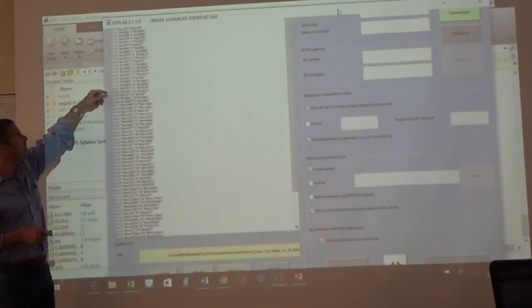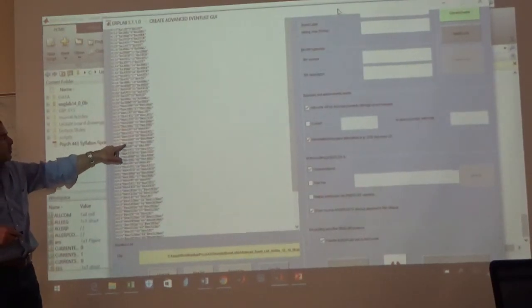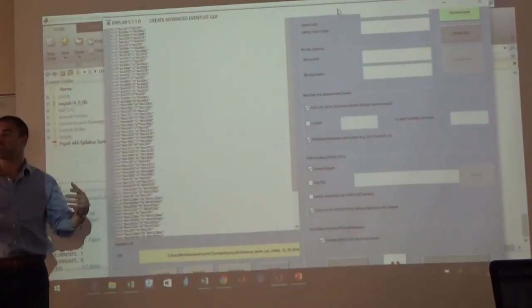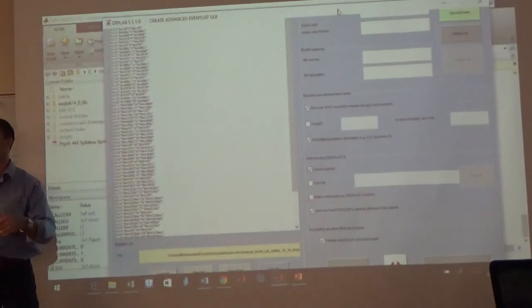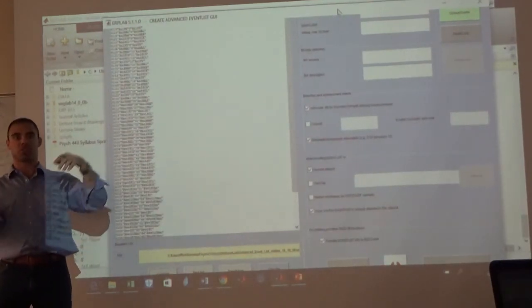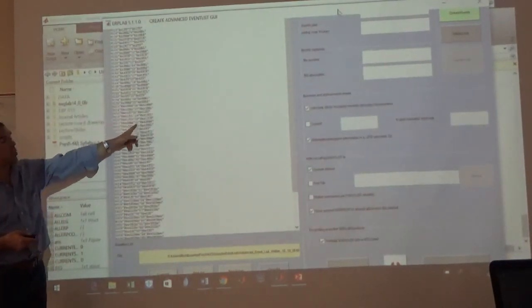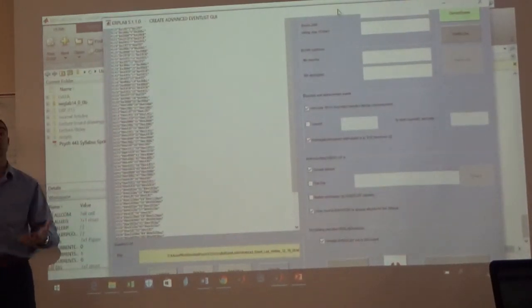So what this does is it gives us, for every one of our 75 event codes, a little label of what it was that happened. Was it animacy or was it man-made? And it gives us a number of the bin. So remember we talked about this idea of bins earlier in class? You can categorize this stuff of brain activity and throw it into bins that say, was this information remembered or forgotten? Was it a hit? Was it a miss? We can bin the information, like you would bin your socks, put all the striped socks in one bin and all the colored socks in another. That's what our numbers here tell you, what number bin it is, and it should go 1 to 75. You guys all see that? That's kind of our structure here with the file that we're working on.